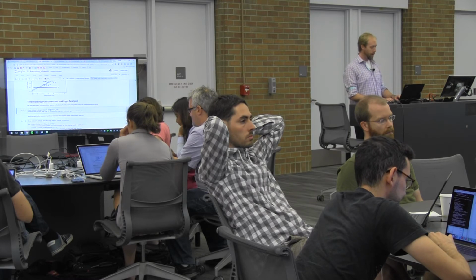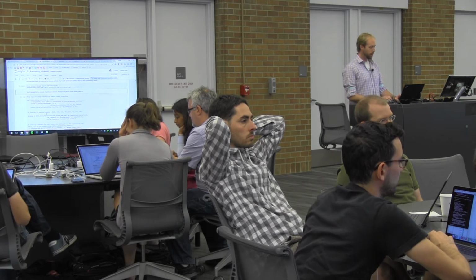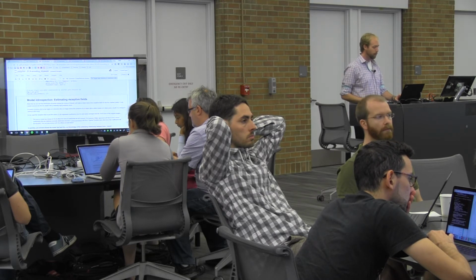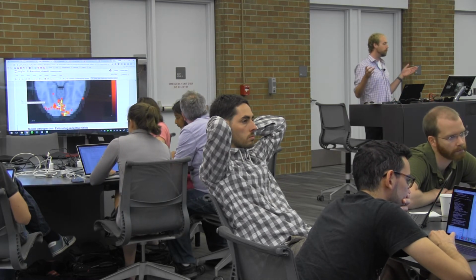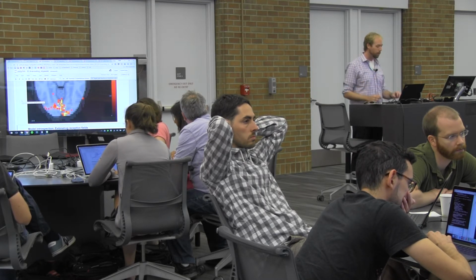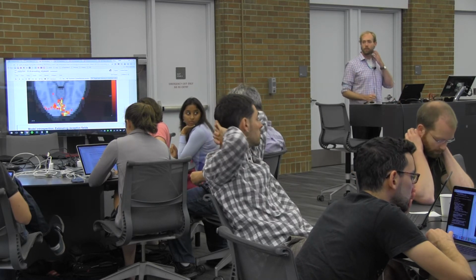Okay, so now we're just going to set a threshold of 0.2 and visualize the same statistical map that we looked at before. I'm adding a little bit of extra machinery here so that we can visualize a couple of specific voxels. This is the same statistical map, but now anything with a score less than 0.2 is removed, so that we can highlight the voxels that are most well predicted. And we're adding a little colored bar around these 4 voxels, because we're going to treat these as voxels of interest.